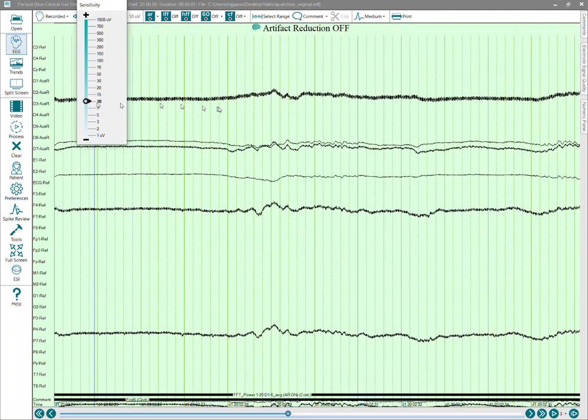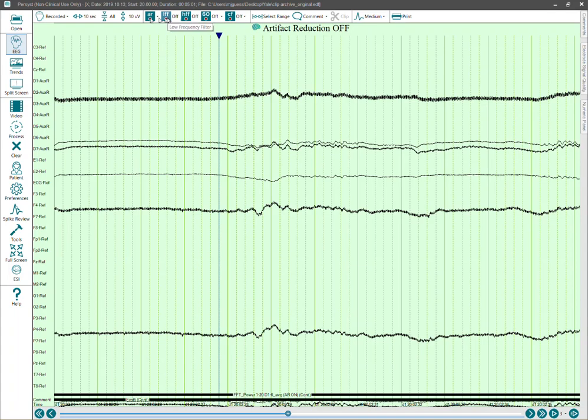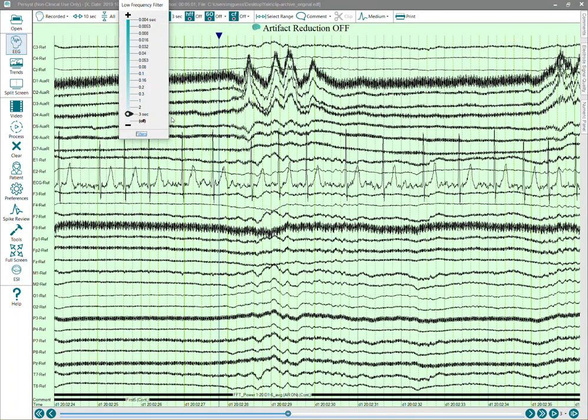I'm going to go ahead and put this back to 10 microvolts. I'm going to see what filter works. And actually, we already saw that when it went to the 3-second or about 0.05 hertz low frequency filter, high pass, everything comes back on. That resolves the offset issue.